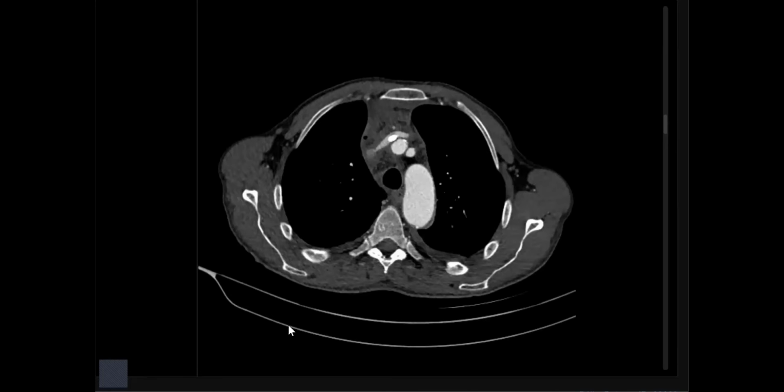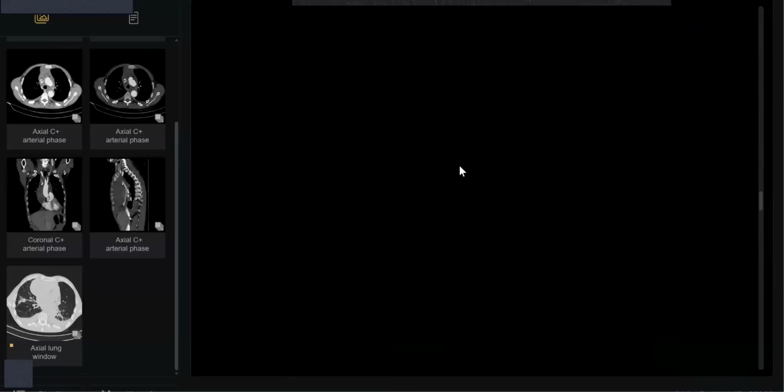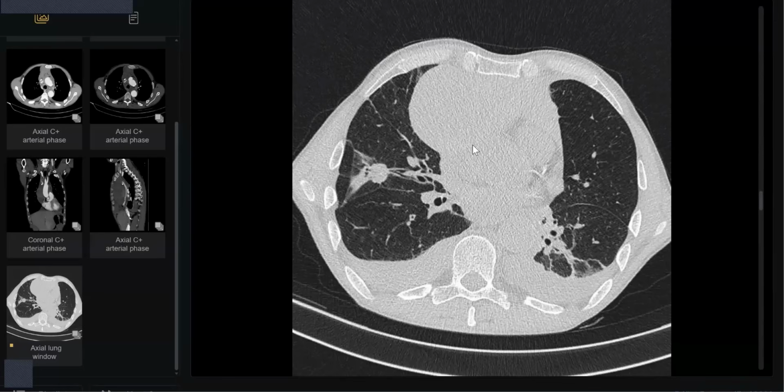I want these words to be in your mind. Okay, in any case, I know it's a single pathology, but maybe there is a double pathology, maybe a related pathology in the lung window. For example, this case, the same case. What do you see?